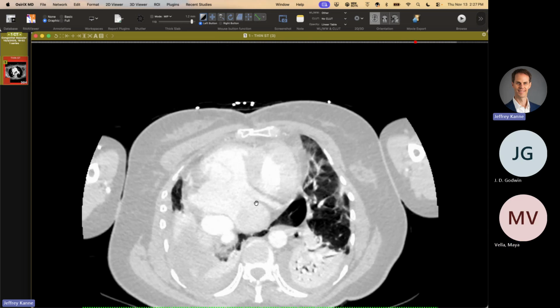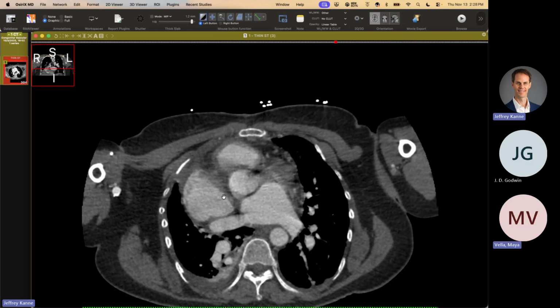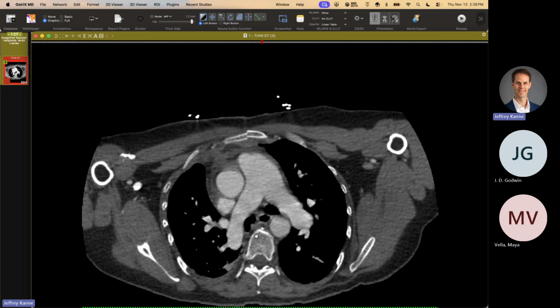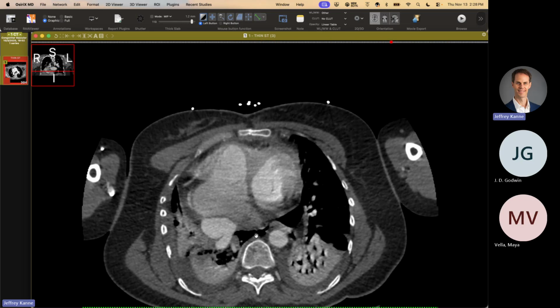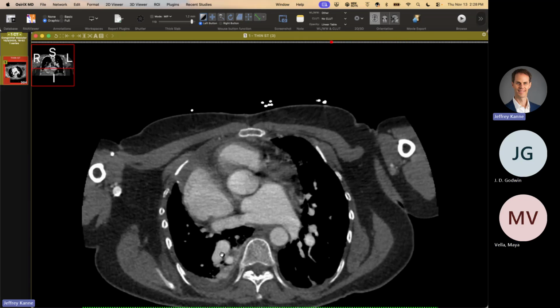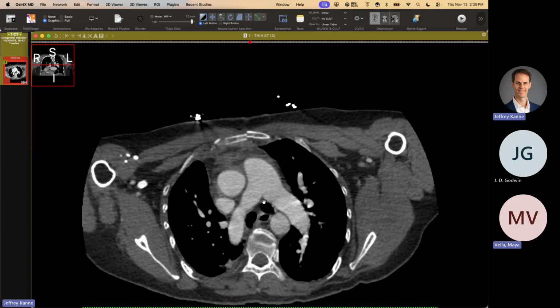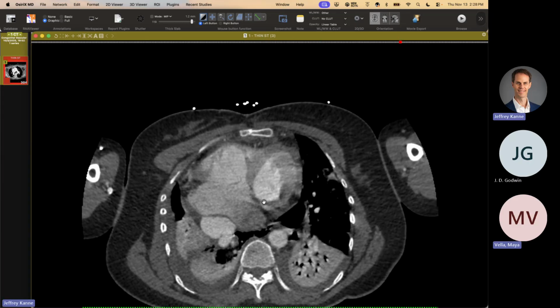The other thing to look for with these that's fairly common, if I can window it, is systemic arterial supply, but she did not have that. There's this tiny little vein coming in here, which is kind of curious. So what they did is they disconnected the scimitar vein and connected it to the left atrium to close the shunt. That's typically the repair if the shunt is big enough. And this was just post-op, and that's why there's all the atelectasis and effusions. But other than that, she had a big enough shunt. She developed some pulmonary hypertension, but there's no other cardiac anomaly in this patient. Nice.